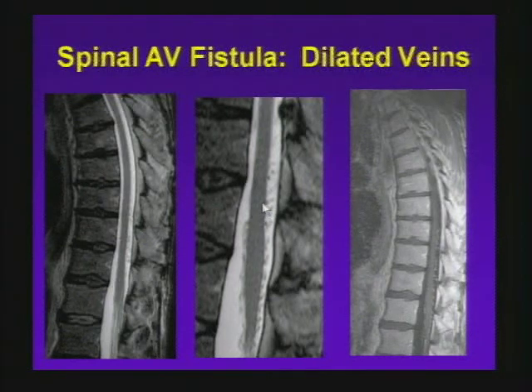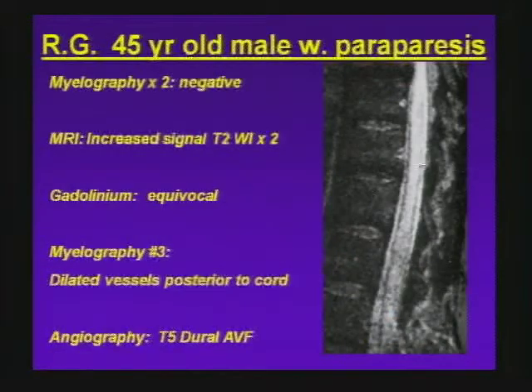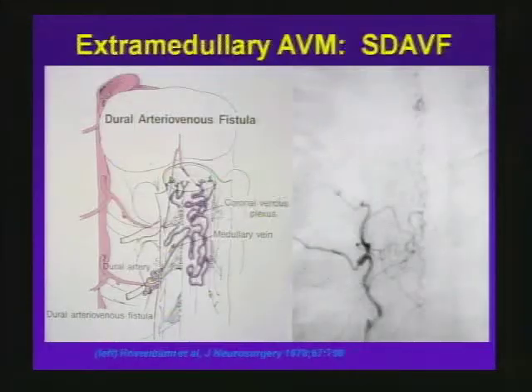That's a spinal dural fistula. And that's a different thing. This is the quiz case from earlier, and this patient had developed venous hypertension of the cord so that these veins, because they get arterial pressure, can't properly drain the fluid, and you end up with conus edema. And here you have a little fistula.